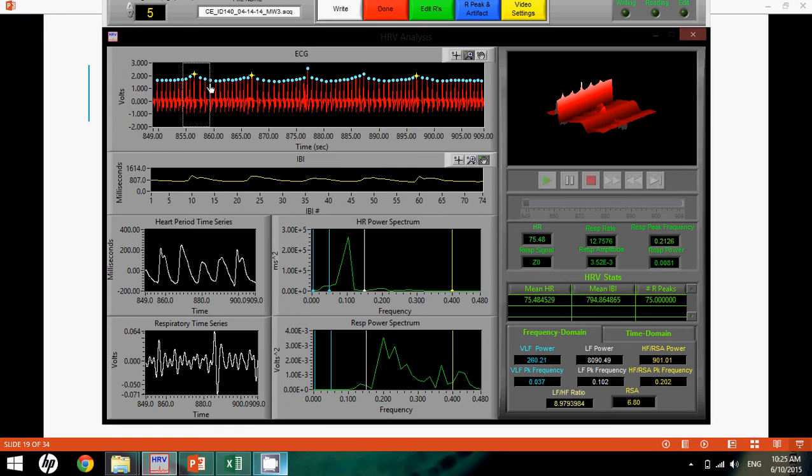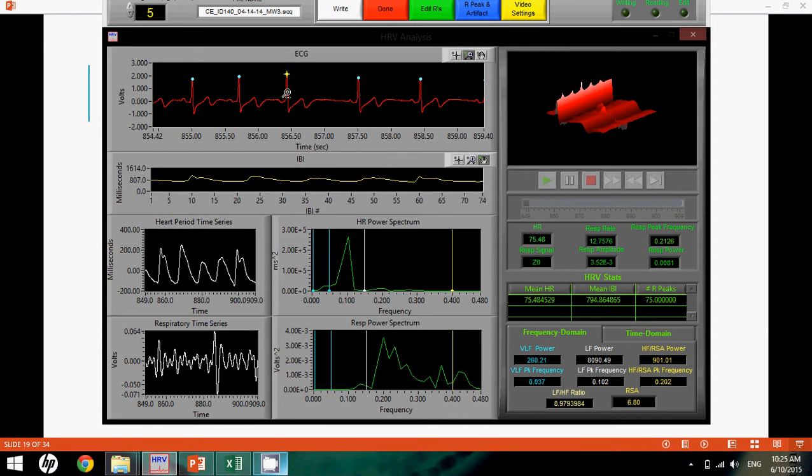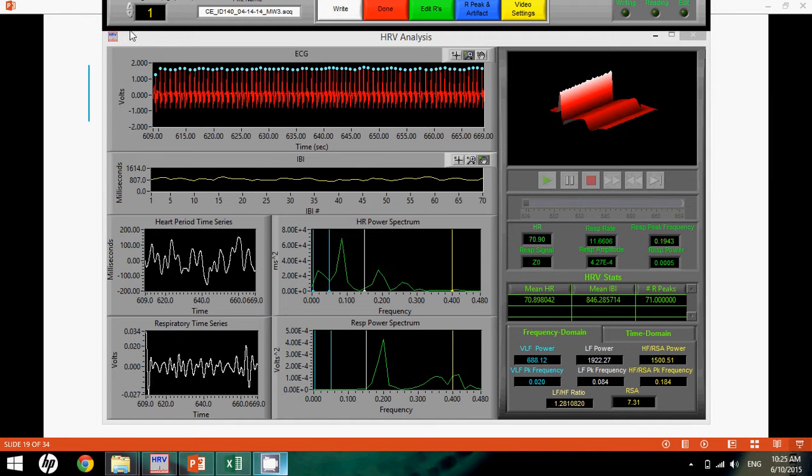It looks like we have 3 different ectopic beats. It might be worth your time to go ahead and look in and see if this ectopic beat is kind of out of the ordinary or not. However, I've already gone through this file for the most part and seen that these are all ectopic beats. So once you've done that, you can just click through. You'll note that we go back to the first segment, and that completes the baseline section.